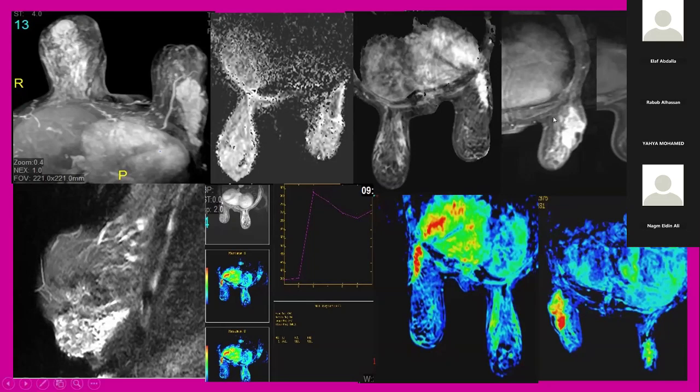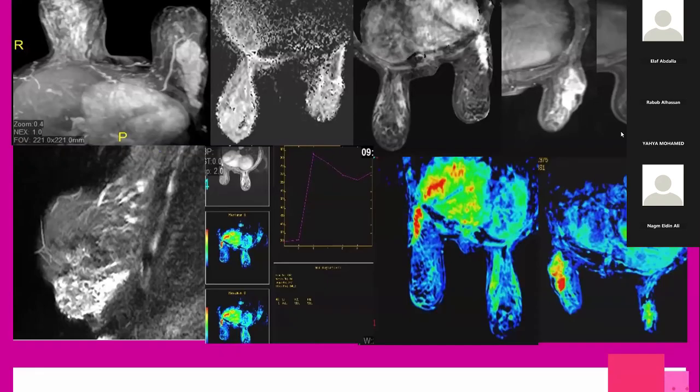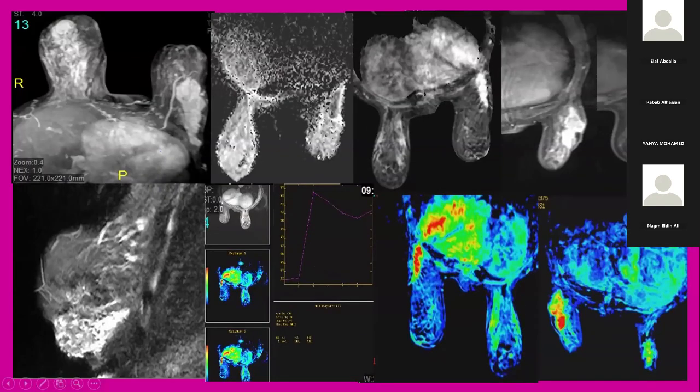Okay, and can you see it here in post-contrast? It is irregular and even invading the adjacent skin. Can you see the skin here become irregular? The skin is irregular, and it even causes some contraction of the breast. And can you see the nipple? The nipple is pointing because it contracted the breast, and it demonstrates some spiculation, contraction and deviation of the nipple toward the left side.